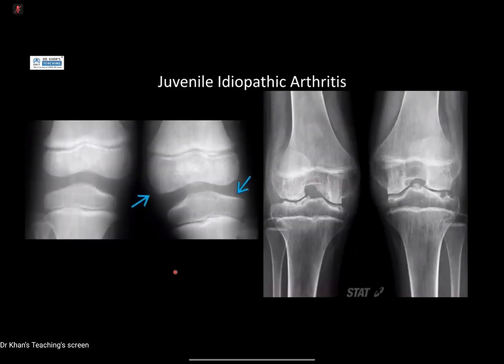So just some things to show you the difference. In this patient, both legs, one is more affected with arthritis, on the left and not on the right. You can see the epiphysis is a lot bigger on the distal femur, and the epiphysis as well. And then this is one that has bilateral JIA involvement of both knees, and you can see that widening of the intercondylar notch.